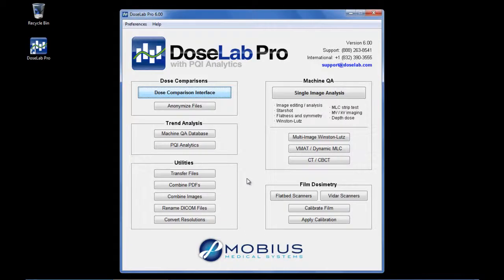This is Nathan Childress with Mobius Medical Systems giving you a demonstration of DoseLab Pro, the full package. DoseLab Pro includes all the machine QA tools in DoseLab TG-142, and it adds support for advanced film dosimetry tools, automatic dose comparisons, and PQI Analytics to analyze all of your IMRT QA.